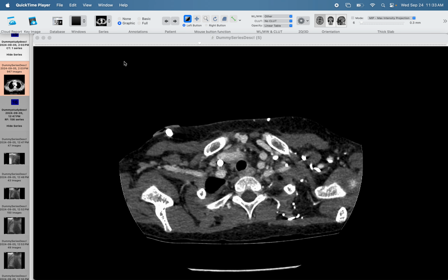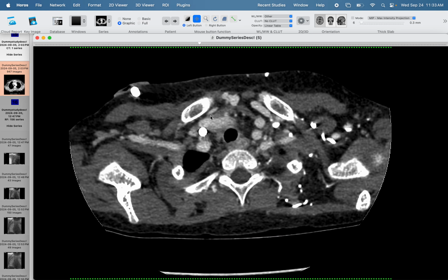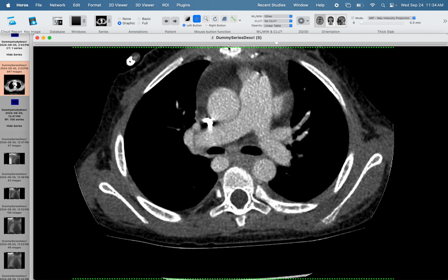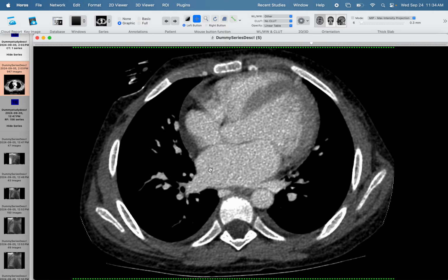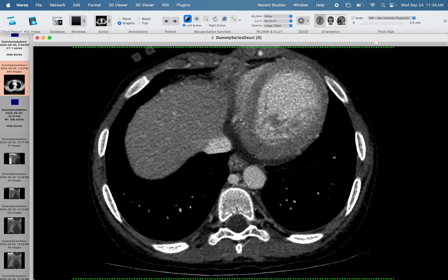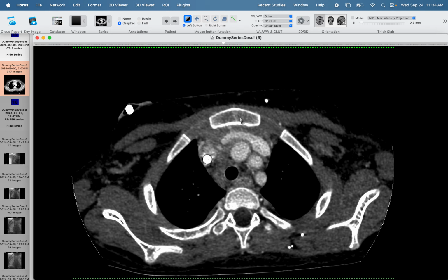So how this image looks in this box will determine how it looks on Radiopaedia. So you want to resize and center the image. You can see here it's gone too far anteriorly, but you want it as big as possible within this box. And you can also format it so that it's the correct windowing before saving them as DICOM files.